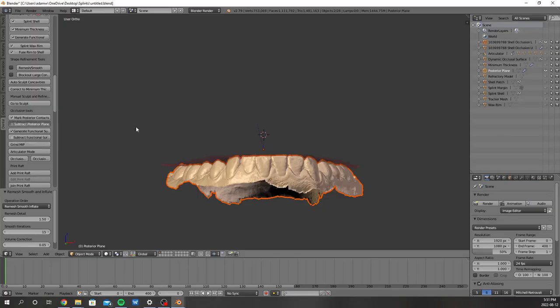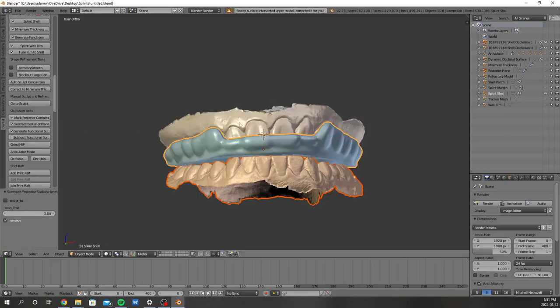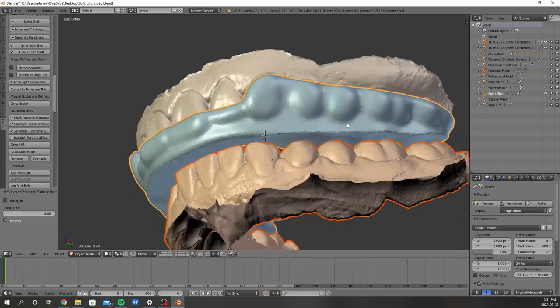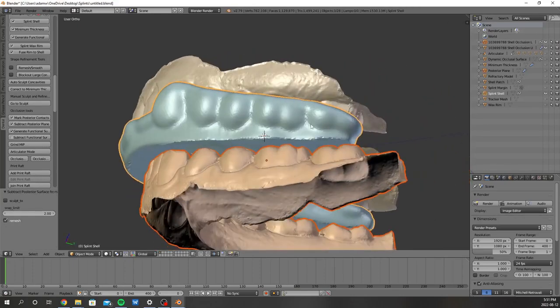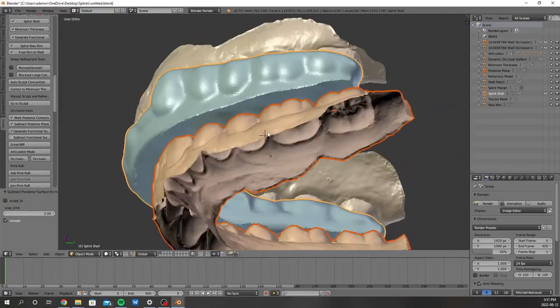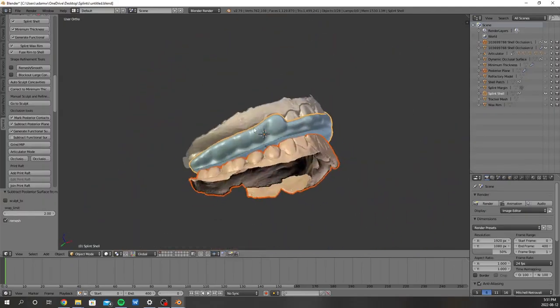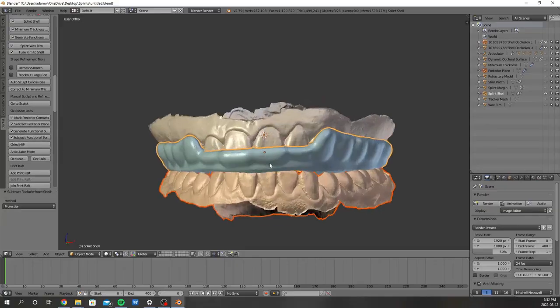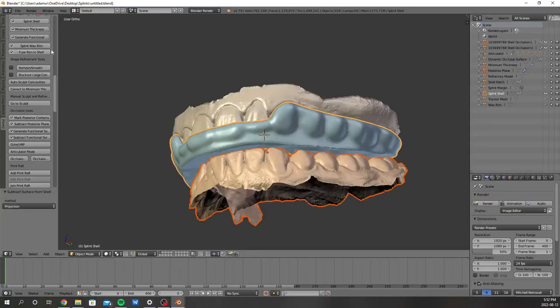You can hit subtract posterior plane, and all that did is those occlusion spots that I just put on the lower jaw, it just removed those from the splint. So now we're going to hit subtract functional surfaces, and it just took those dynamic movements that we had from before and removed those from the splint. So sometimes you'll see giant ramps taken away from the front here.